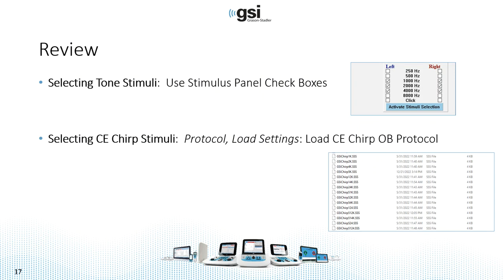So to review, if you want to use tonal stimuli, you're going to use those check boxes and select Activate Stimuli. If you want to use CE Chirp stimuli, you're going to load a test protocol from the Protocol Load Settings menu.